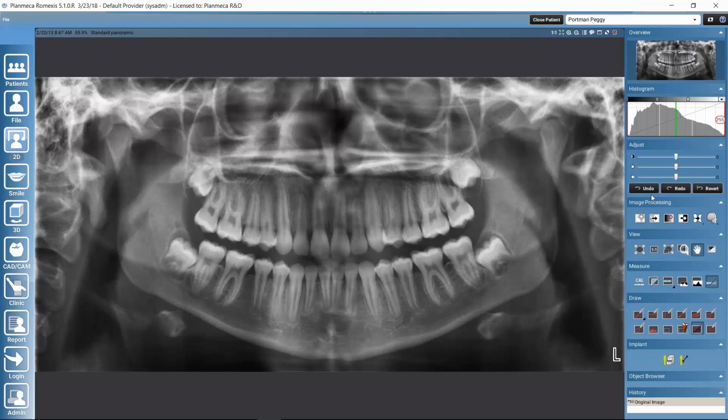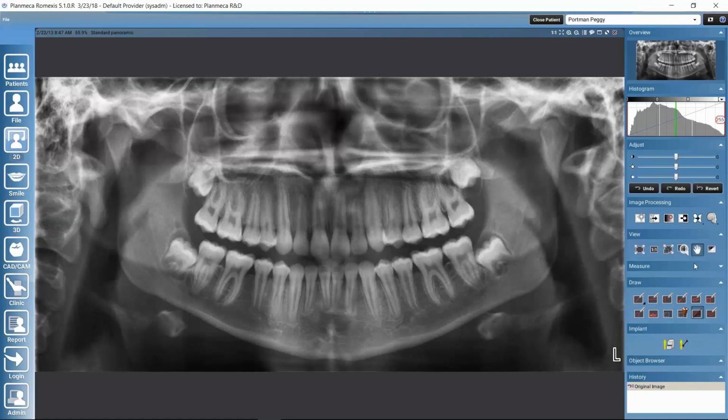And then it's also possible to right-click on top of an icon, and we can get to customize the toolbar. So we could select here which functions are visible and which not. So if there's something that we never use, we can hide them so that we can get the simple toolbar.